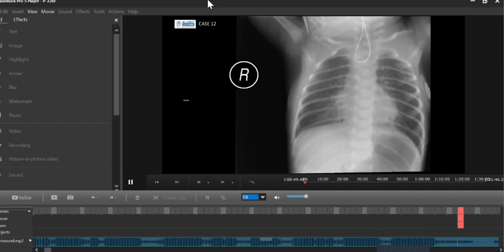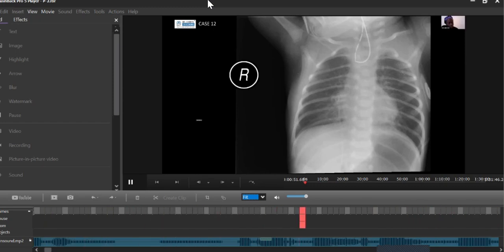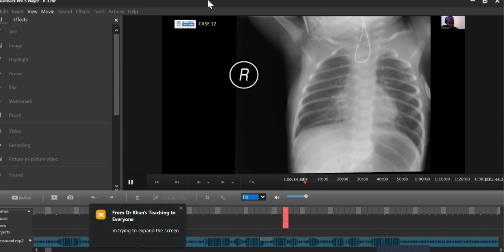Like a heart monitoring lead. You can see down here, this is the sticker that they place on the chest, and then there's a similar lead on the left side of the chest wall. So no tubes. So apart from the esophageal atresia, is there anything else that you see?